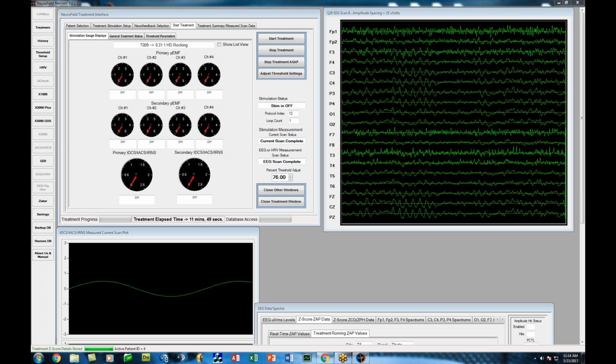A 4K laptop is definitely going to make everything very, very tiny. It makes everything tiny, not just NeuroField64, but anything that you run on it. So the way you set your resolution is definitely going to have an impact. But what we found was that if you see any distortions of the text in the program, what's happening is that Windows is using a scaling feature that it automatically turns on. If you're using anything other than the 100% scaling that Windows should be displaying, then the text can be corrupted.